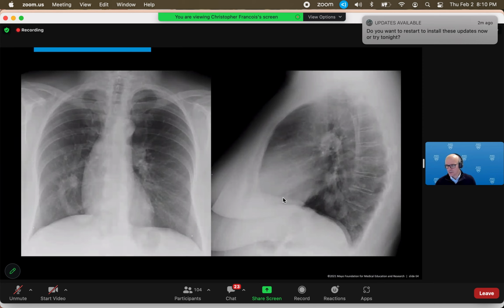Next case, this is another classic board exam kind of case. Beautiful. I can take it because I cheated on the first one.